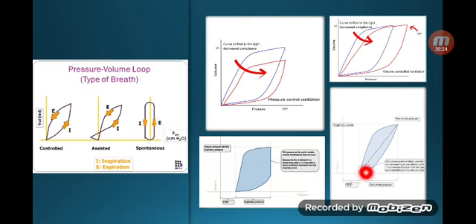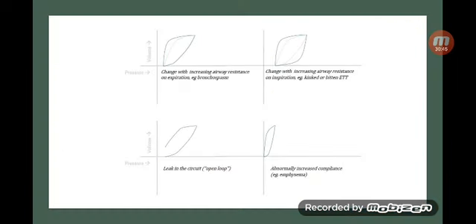Here it's different. The inspiratory limb seems fine, but the expiratory limb seems further away from there. That might just be a bit of an expiratory problem. So maybe a marginally obstructed lung, maybe a bronchoconstriction, something like that. Again, it's more evident here. This is where the inspiration is fine, expiration is far away. So that is bronchospasm or bronchoconstriction. You might benefit from bronchodilation here.